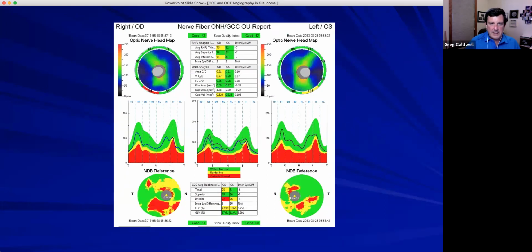And another patient here, I was starting to think that maybe in my patient population, all my patients would be left. But again, let's jump down to here. The ganglion cell complex is 6, 8, and 4. The focal loss is saying, it's more focal, doc. Scratch your head, maybe look a little bit closer, even though it's not meeting that, say, 10 criteria. This 8 is.